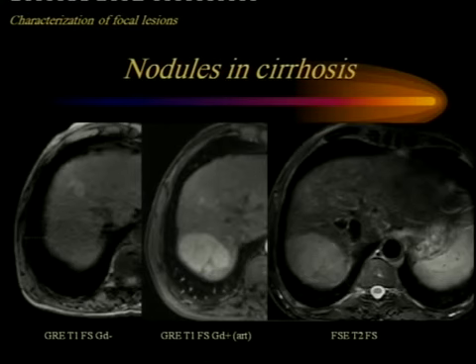But in addition to that, you'll notice that there's also actually another lesion here. So there's a lesion that is slightly hyperintense on the pre-contrast T1, but has a central hypointense lesion within it that enhances on the arterial phase and shows some bright signal intensity on the T2 weighted image. So illustrating this so-called nodule-in-nodule appearance of the early hepatoma developing within the background of a dysplastic nodule. So the characterization can be quite vivid and quite accurate with the proper use of MR.